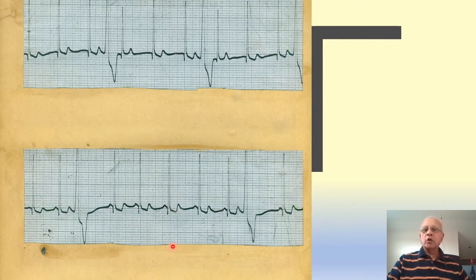Whereas when you come to the lower panel, the QRS is a little more closer together, and it works out to 19 millimeters, which I measured. And the lower one turned out to be 78 beats per minute. So there is a difference of 10.